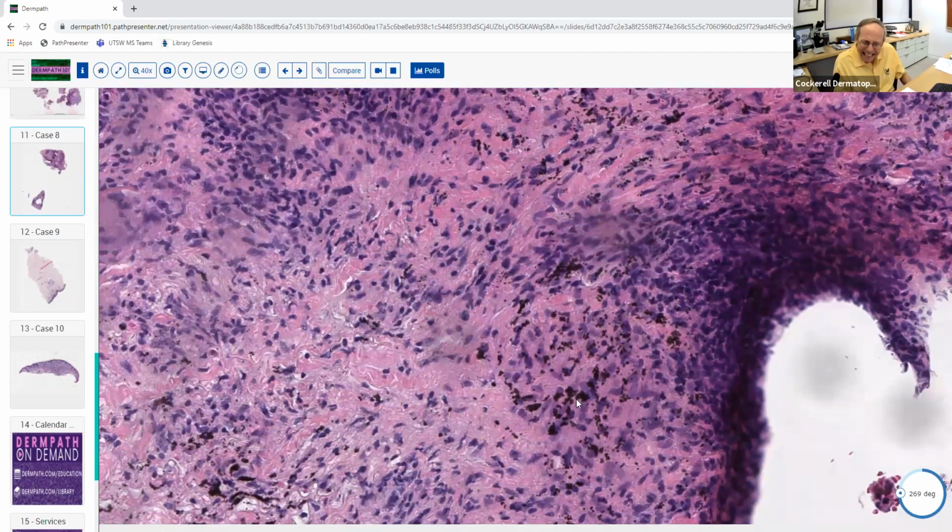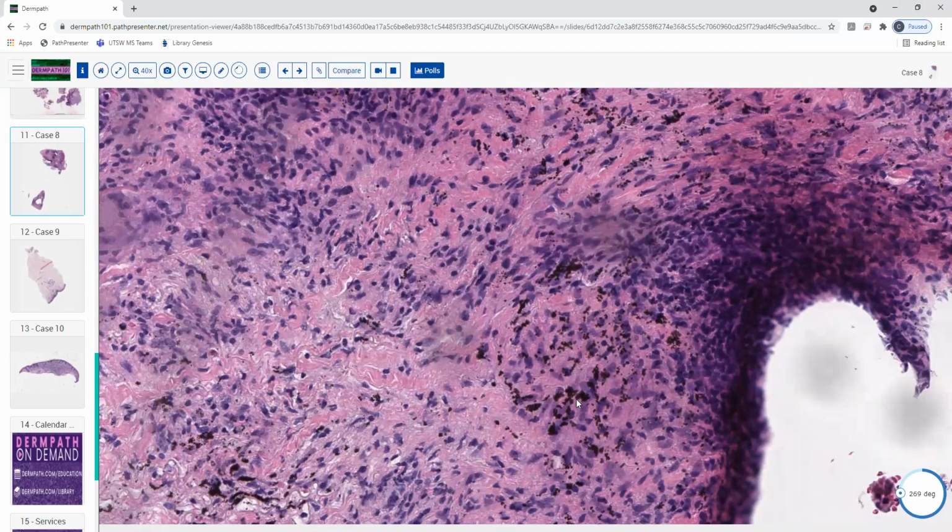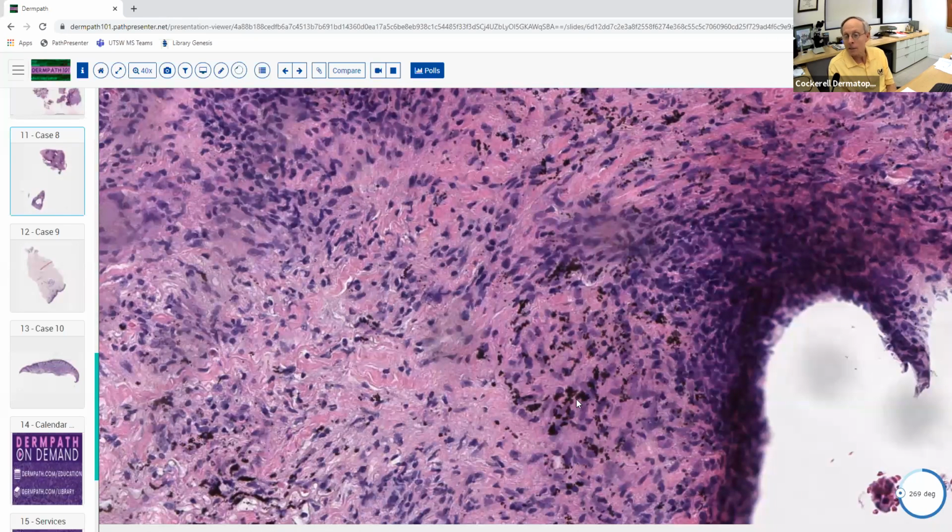Well, not really. So in other words, if you biopsy somebody that's got a red tattoo that says mom on it or something like that, does it look like this? I'm really not sure, honestly. Yeah, there's the color of the tattoo pigment. Actually, you can see it under this microscope as well. So if it's red, it looks red, and cinnabar is the chemical, the element that they use. It's called cinnabar that actually gives you that red color.